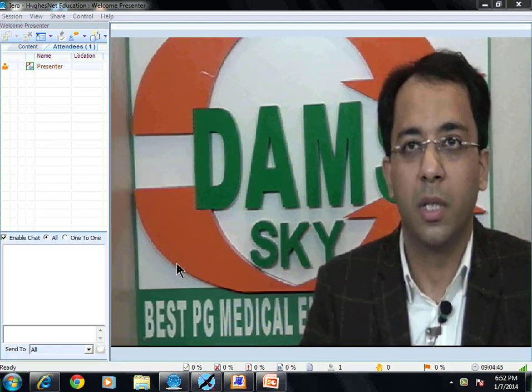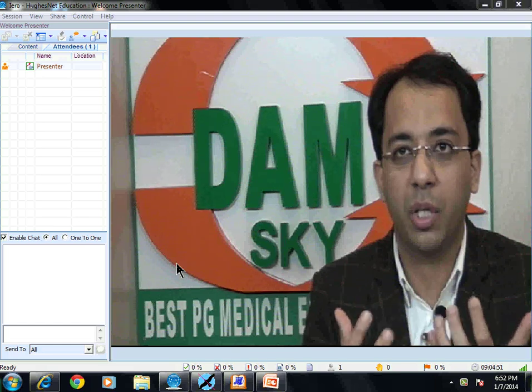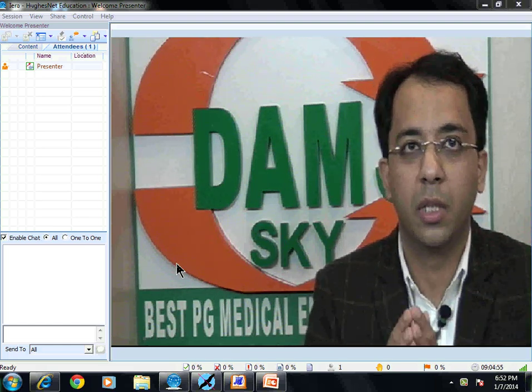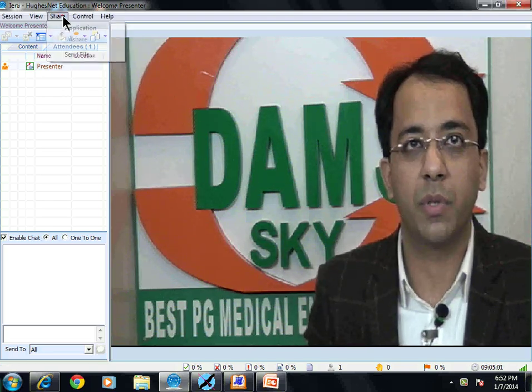Hello friends, today I'll be discussing a unique case that some of you might have seen before, but it has some unique findings where we are able to diagnose radiologically on plain films. So today's case will be totally on plain films. I'll be showing you the X-ray images and then I'll be discussing the images with you.